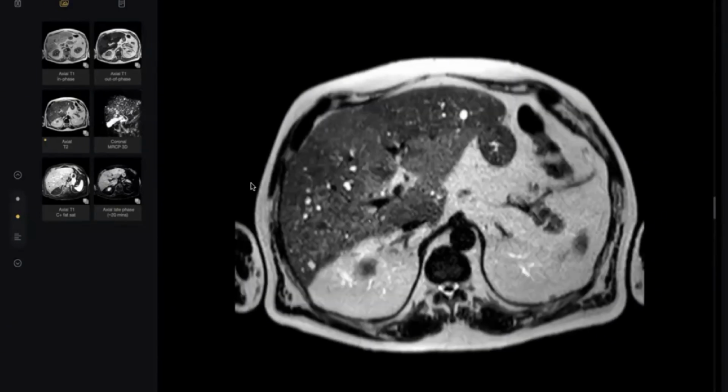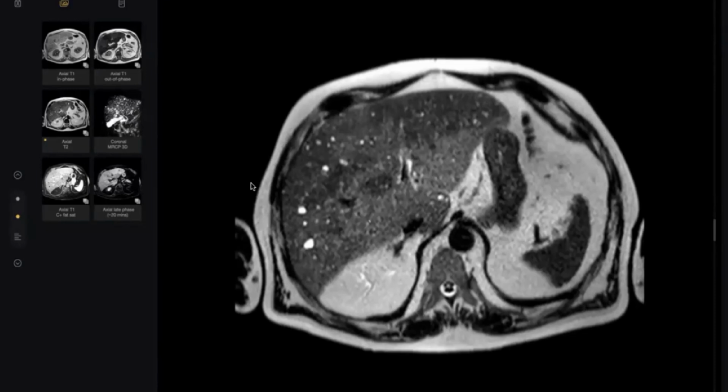They appear very smooth shaped. They are not irregular. They are very rounded and oval shaped, and they appear cystic. So, this is against or with biliary hamartoma. I guess this is typical of biliary hamartomas.